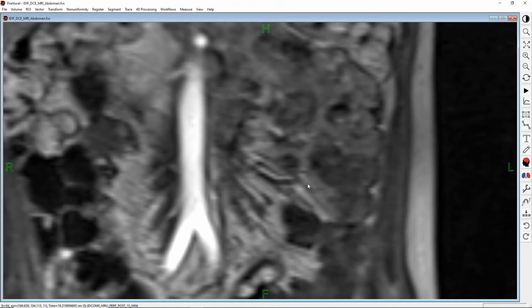To estimate vessel diameters, lengths, and angles, use the Construct Polyline tool to draw vector lines with 1 or 2 segments. To estimate vessel width, click the tool icon, then click once on one side of the vessel, move the mouse, and hold the crosshair over the other side to see the length measurement. To estimate an angle, click the tool icon, then click twice along the vessel and hold the cursor above the vessel's new direction to see the angle measurement.